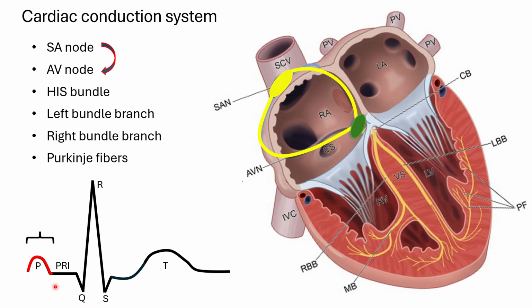Now, the next stage is going to be a pause in the conduction at the AV node, and at this point the atria are contracting.